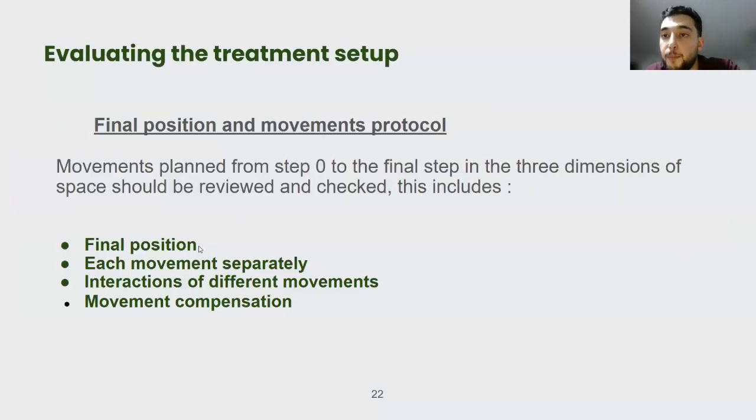Second, after confirming the bite is correct, I go and check the final result before getting into staging. For example, I'm going to have a treatment setup with 30 aligners. If I start wasting my time with the staging of this and that, I might miss that the final result the technician set up for me in the 3D simulation is not the final result that I want. So all the effort I put into correcting the staging or writing notes about the staging is going to be wasted, because when you change the final result, you're going to need different staging based on that. So I always go to the final result first.